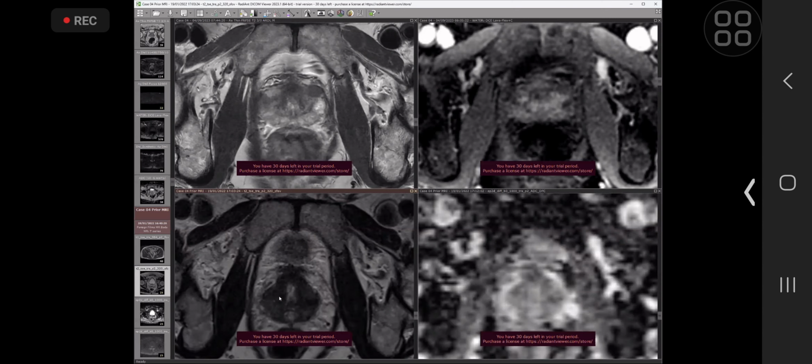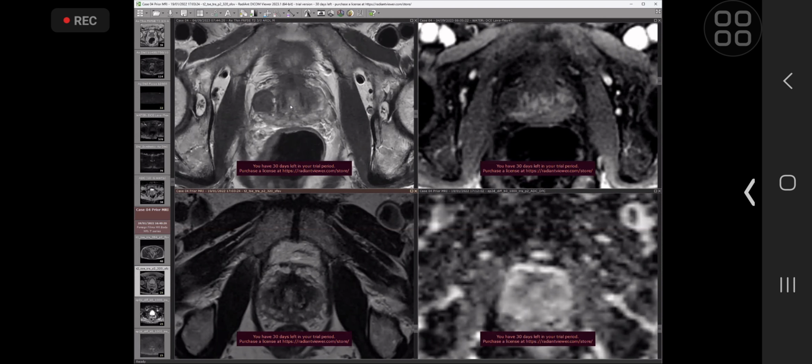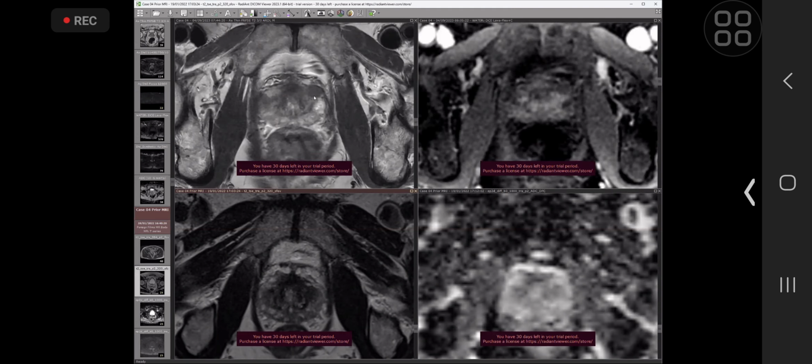So prostate MRI, prostate cancer, even aggressive cancer, doesn't tend to grow that quickly. And in a patient that's had bladder cancer and has had BCG therapy specifically, in this case we could correlate that from the history. We think of the possibility of, could this be granulomatous prostatitis relating to that previous BCG therapy? And the fact that they've had that in the history, and the fact that we've had a previous MR in relatively recent time that was normal, gives us that confidence.